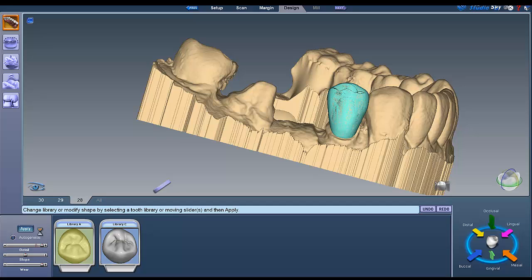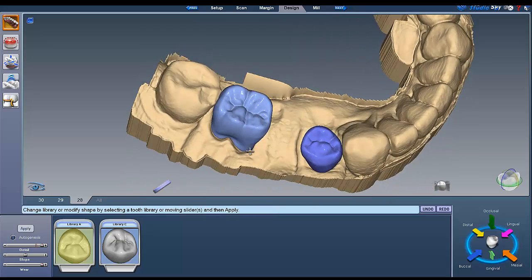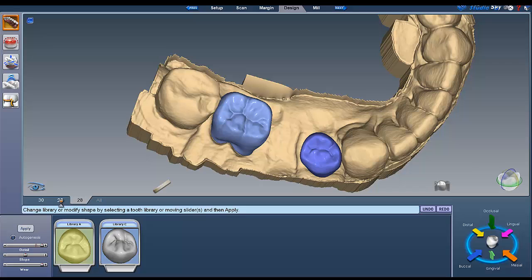Again, you see how that proposal kind of jumped to the position that we started at. Now it's just having to kind of tweak things a little bit. And let's see if we should have two reasonably good proposals there. Yep, not looking too bad. And now we're going to do the same thing for the Pontic.